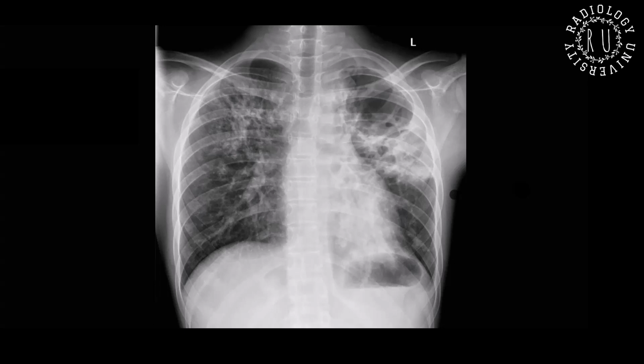There's pleural thickening over the left lung apex, and also a blunt left costophrenic angle suggestive of a small pleural effusion. The heart size is not enlarged. There's no destructive bone lesion. Constellation of findings would suggest a diffuse process of the lung. If this patient is acutely unwell, I'm concerned about atypical infections such as tuberculosis.